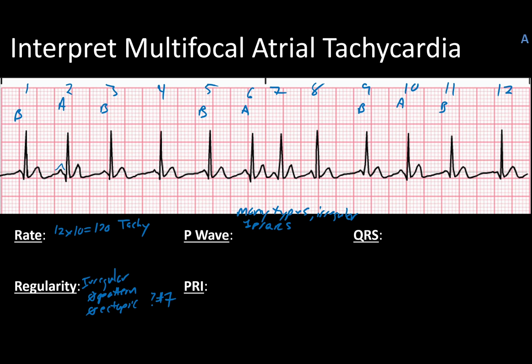So the next question is, do I have a C? Well, if you look at number 4 and number 8, they're pretty similar, so we could probably argue that those might be C, or they could just be derivations of something else, so they're a little bit questionable. But definitely number 7 has its own version as well.